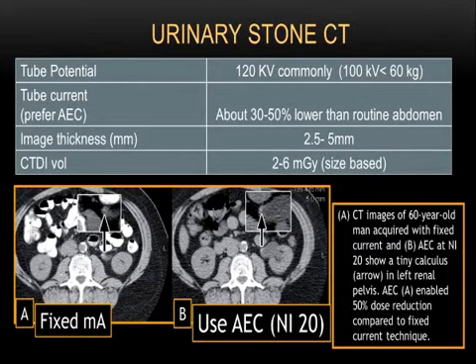In that case, I would invest some time and do some other creative things, like creating maximum intensity projection images, or MIP images, which help you cut down the noise and enhance the calcified stones from the noisy surroundings. That's how you can get some of the dose reduction, even though your radiologist may be using thinner slices.